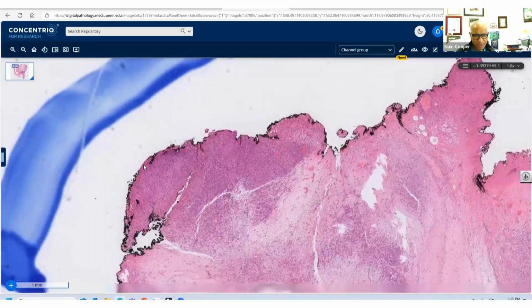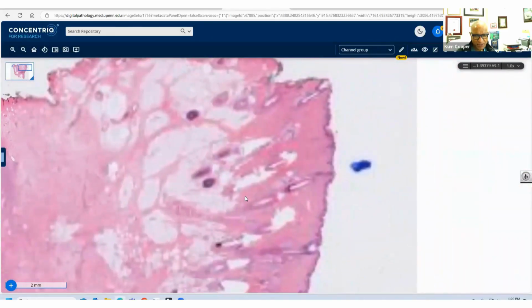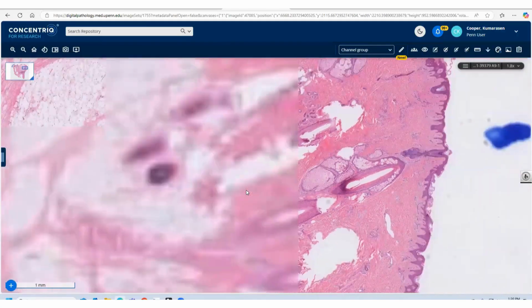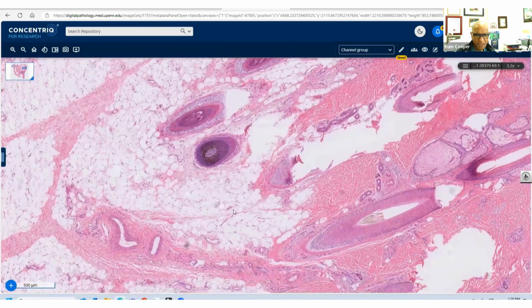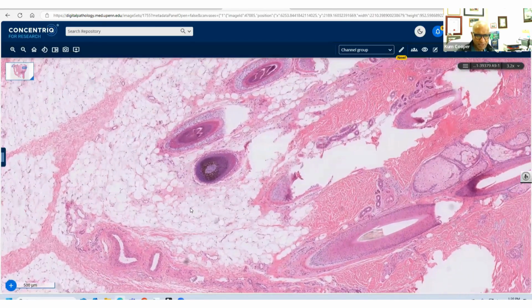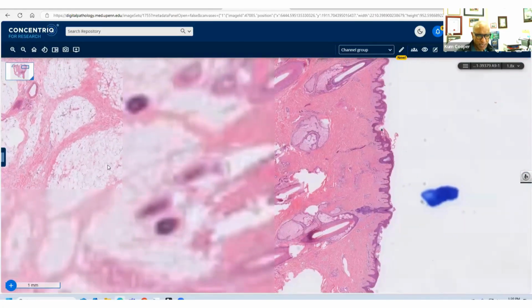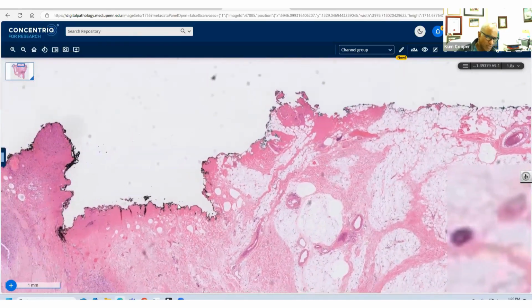And remember, those are typically dermal or epidermal based, right? And fibroblast-like. So morphology-wise, this is pretty deep. The desmoplastic is typically dermal, subcutaneous. You want lymphoid tissue, you want necrosis. But yeah, that's a good thought. Very good thought.